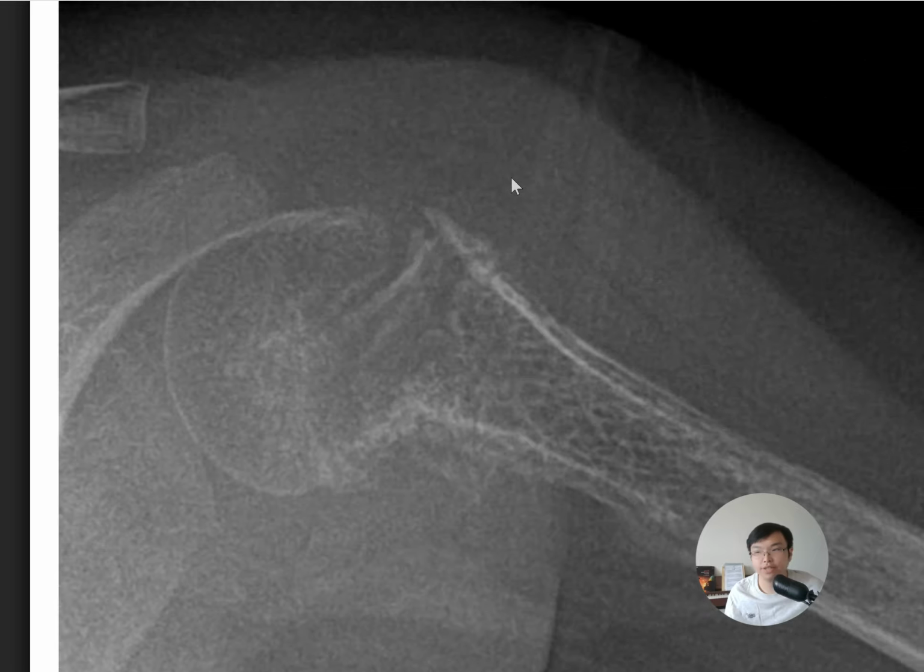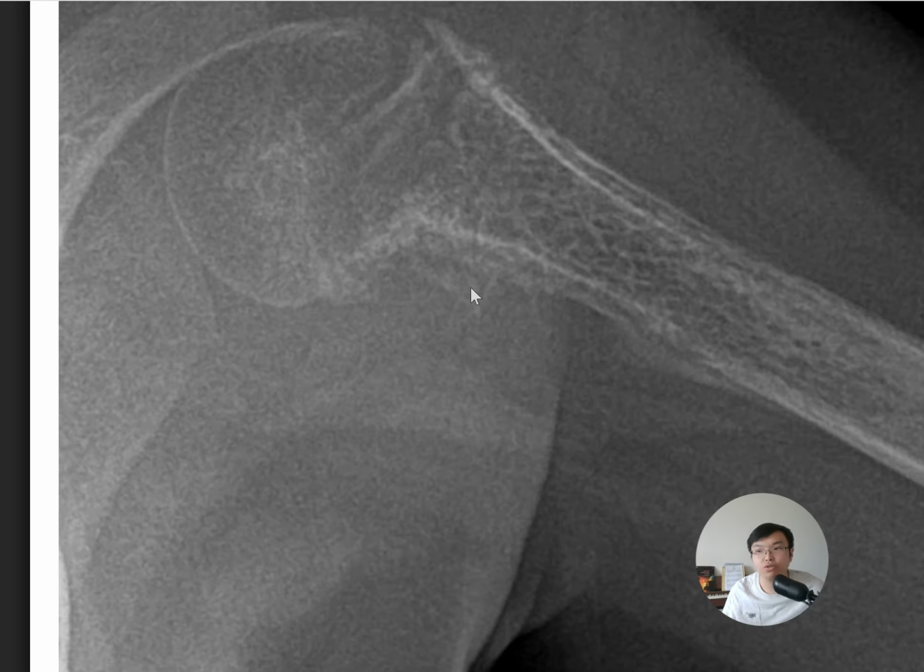So in this case, we learned, firstly, how we can delineate an aggressive bone lesion, and then also what types of aggressive periosteal reaction are usually associated with Ewing sarcoma, and then also try to assess the extent, especially the local extent, involving the same bone, including one joint above and one joint below. And then, if the lung is included, try to see any lung metastasis. And then always use orthogonal planes to ensure that you have a better delineation of the periosteal reaction, bone destruction, as well as any pathological fracture.